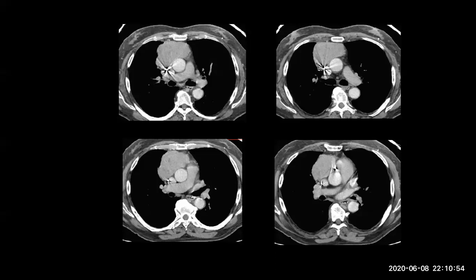Age of the patient. Okay, very good. We should ask for the age of the patient. This patient is about 50 years old. So it goes with the thyroid, retrosternal goiter. What's the age, sir? 50 years. So I put lymphoma. She put thyroid as a differential. Anyone put thymoma? Thymoma first, and then lymphoma.